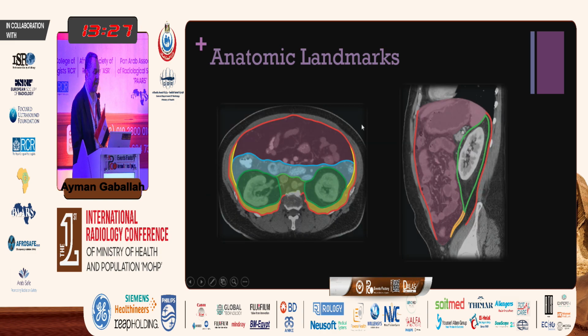And here are more diagrams, a color overlay over CT images. You can see the peritoneal cavity and the retroperitoneum. And the retroperitoneum has the anterior pararenal space, the perinephric space, and what we call the posterior pararenal space. The peritoneum has the peritoneal structures, including the bowel, and also the solid organs like liver and spleen, but kidneys and pancreas are retroperitoneal.